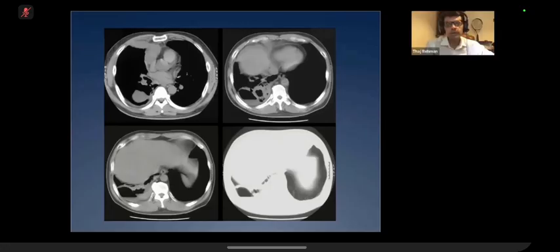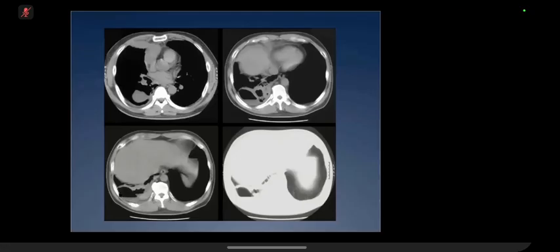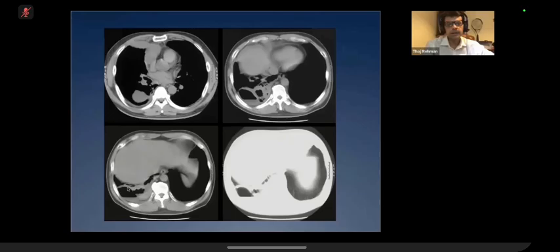So what is this now? What's the pathological term for that? It's an encysted empyema. Yeah, it's an empyema, because that's in the pleural space now. Now, there is something else that will tell you why this happened in this person.